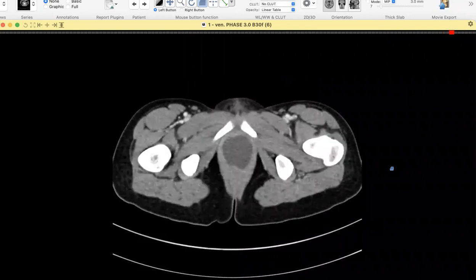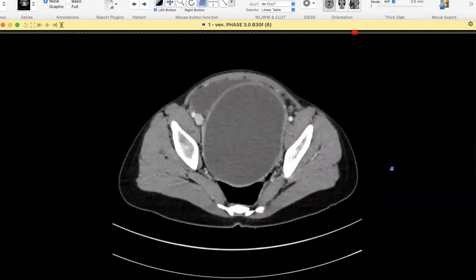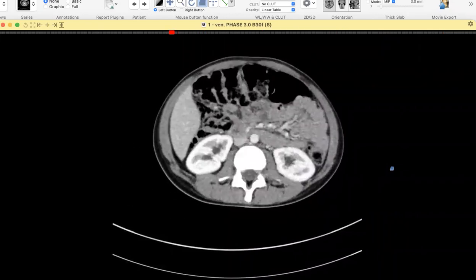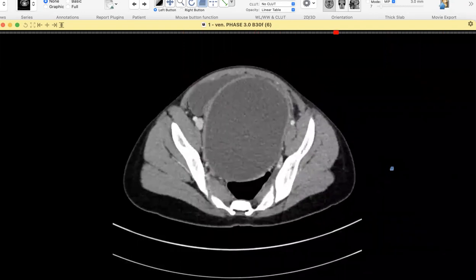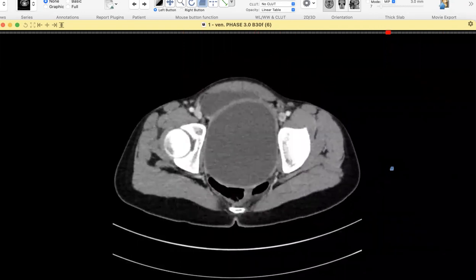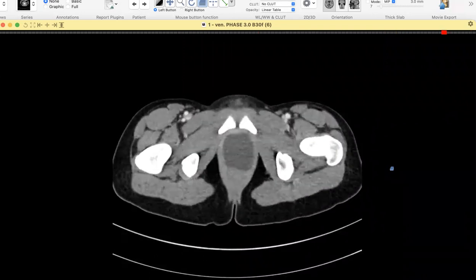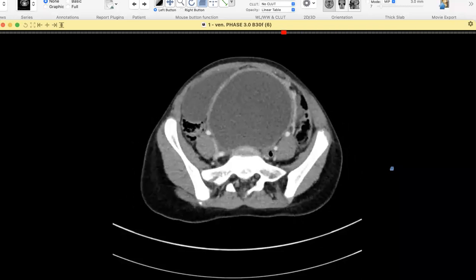So upon some more discussion with the clinician, it comes to be known that this patient has primary amenorrhea. So if this is primary amenorrhea, this could be hematometra or hematocolpos, because the cyst is extending through the vagina downward also.